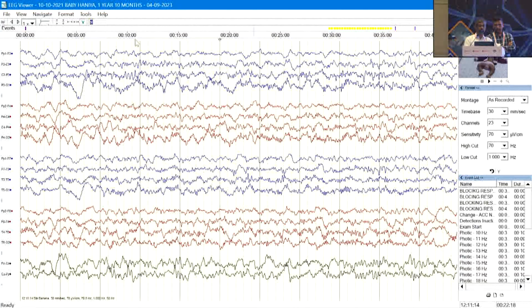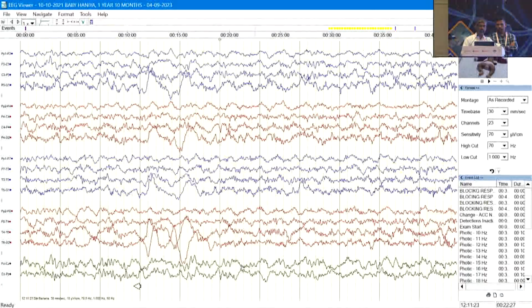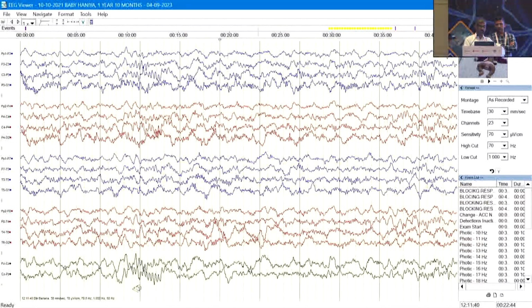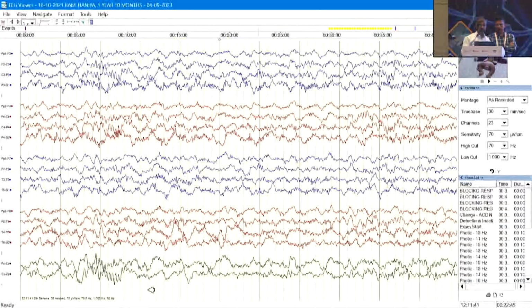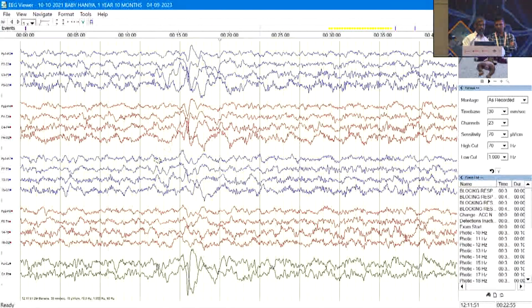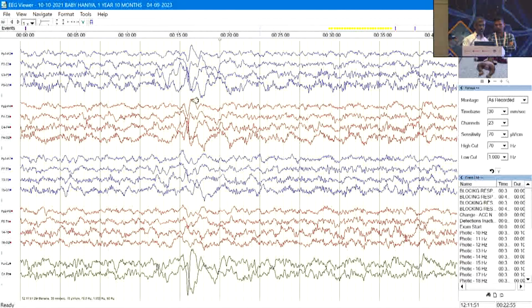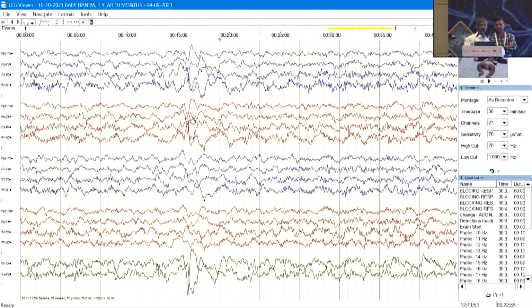And the sleep spindles, you can see for a 2-year-old, how these are very well localized to central regions. This is another sleep spindle. Okay, so this is looking more like an older child only, central parietal region, more localized, more shorter compared to the young infant where you had a longer sleep spindle. So this is another high amplitude activity, biphasic, phase reversing CZ, C3 and C4, and this is K complex.